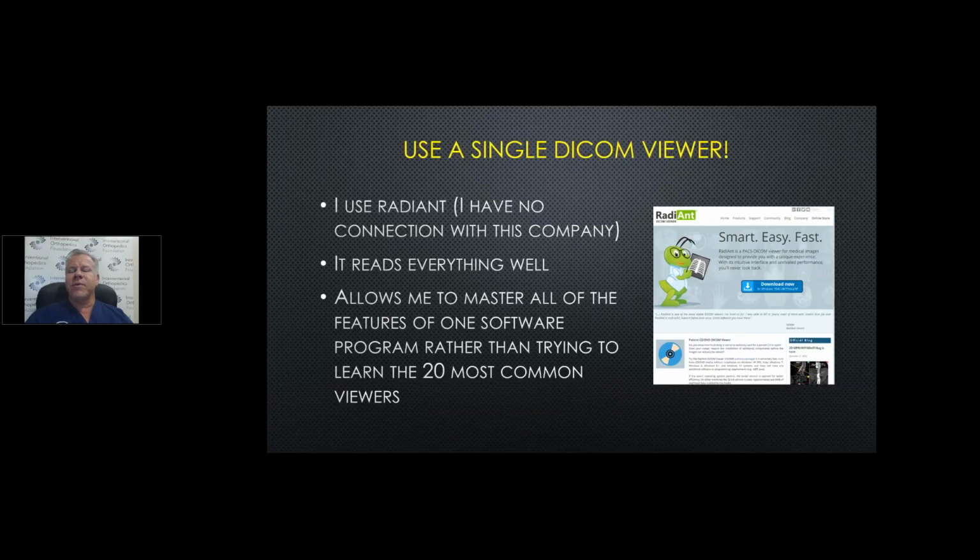Now, one of the first things I'd recommend is to get a single DICOM viewer. I use Radiant off to the right there. I've got no connection with that company at all. It reads everything really well. And it also allows me to master the feature of one DICOM reader without having to learn 30 or 40.